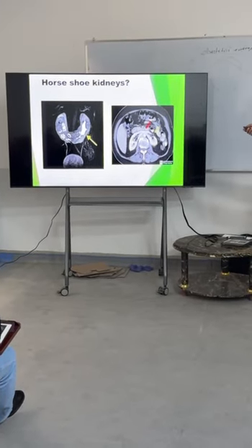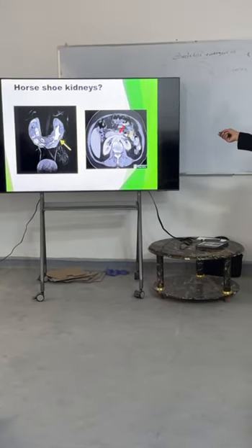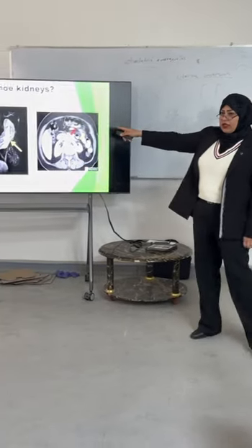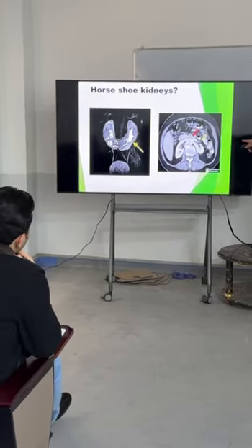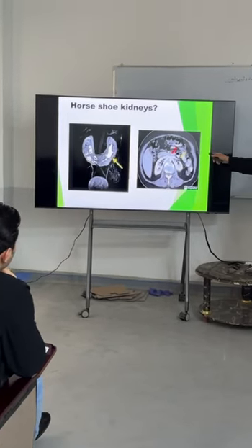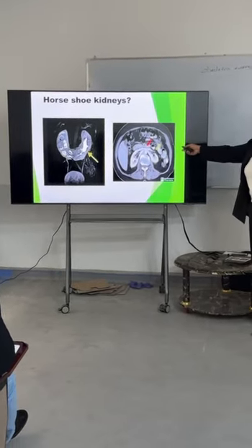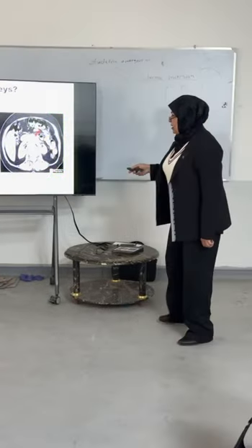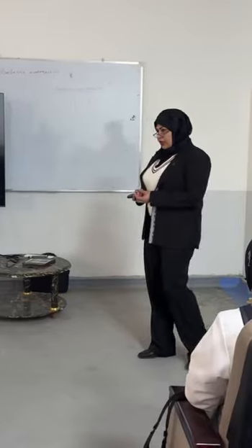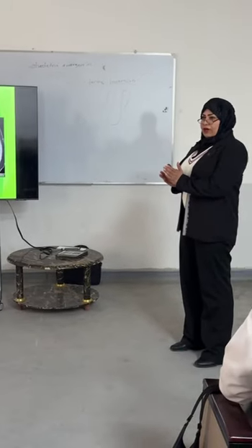The second one, is this contrast or not? Contrast. Here it is very clear. Why do we say it is contrast? The aorta, arterial phase, yes, excellent. The aorta. It shows union of both lower poles in front of the spine.